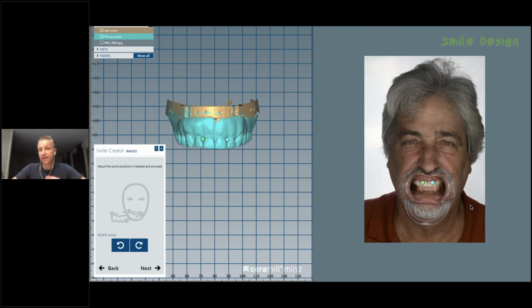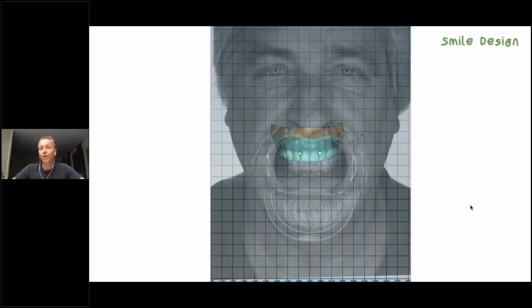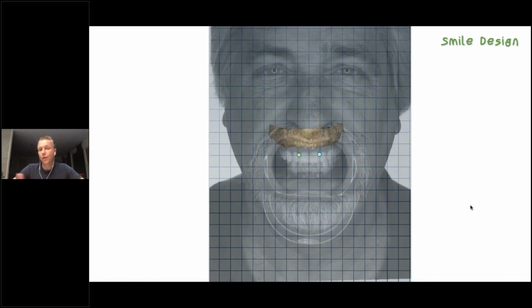And we do this in the M-Smile module, starting with putting landmarks on both sides. So we see here we're browsing for similar landmarks to be able to have a merge. And now we see we were able to merge the model record, the 3D record, to the 2D record, to the photo, and can now make certain things more translucent or more opaque to play with.